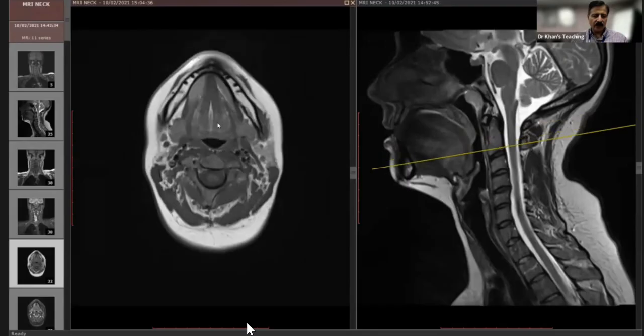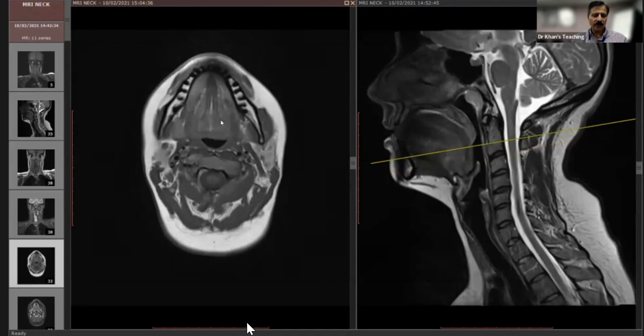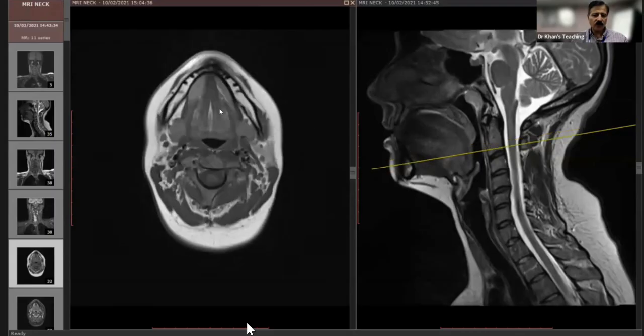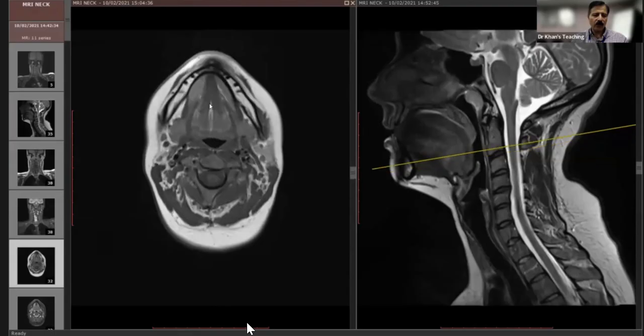Now you can imagine that there is a muscle here. You see this thing? This thing. So this has to be the genioglossus muscle. And do you see this thing here and this thing here? So this has to be the geniohyoid. You know, right and left. So this is genioglossus. Now this part, you see, we are here. So here, this is all sublingual space. Sublingual space.